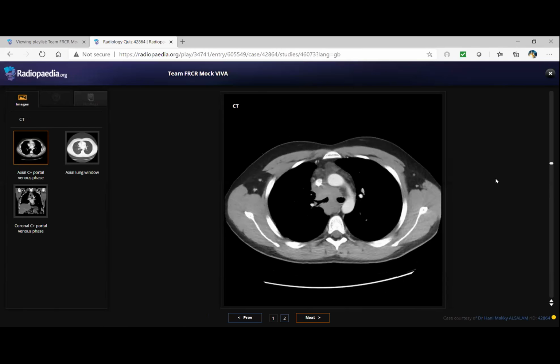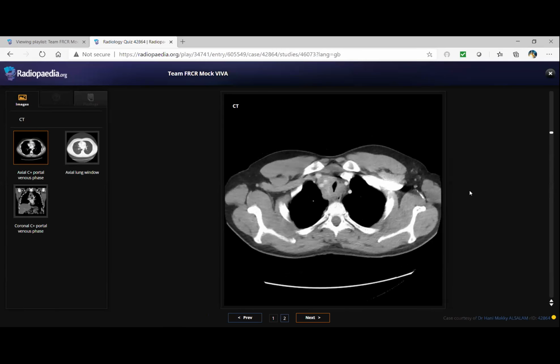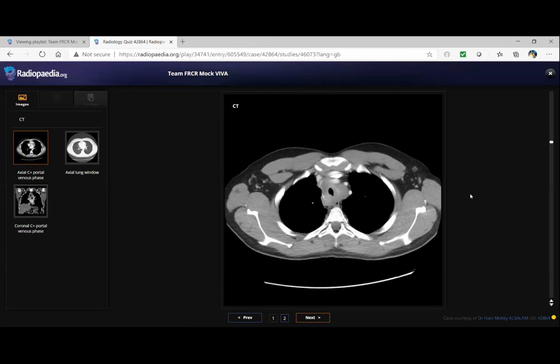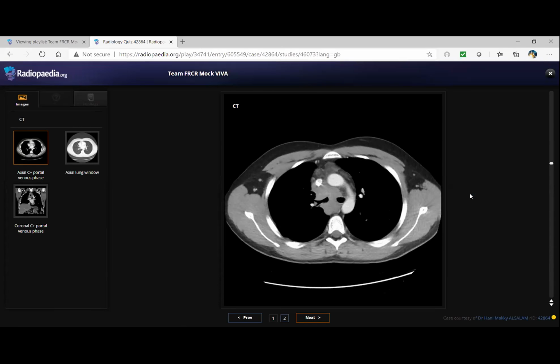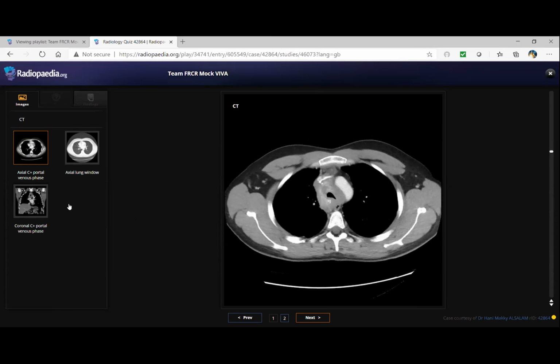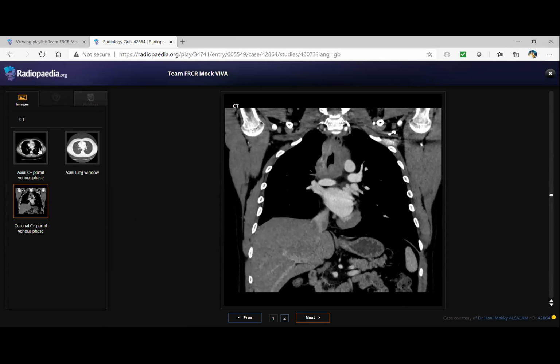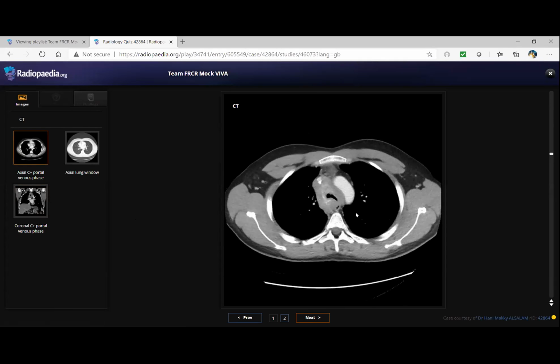Yeah, these are the serial axial sections of CT, just in mediastinal window. The findings in the X-ray are confirmed, with narrowing of the trachea and a surrounding soft tissue mass around the trachea with some heterogeneous enhancement, and that is causing mass effect upon the great vessels. Let me show you the X-ray. That's also causing encasement of the vessels.